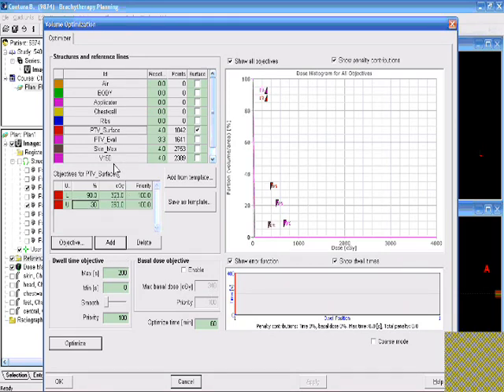And we'll put in the ribs as well, very similar to the skin. Here we want 125%. And that will be 425, just like last time. Set the priority way down because it's mostly for evaluation. Need to do that for the skin max too.